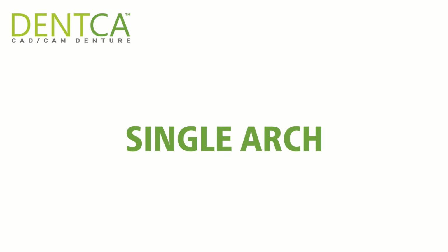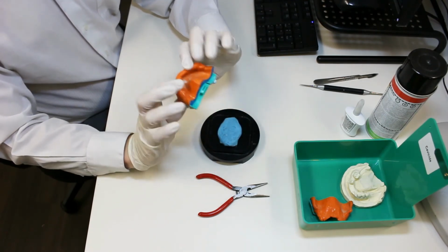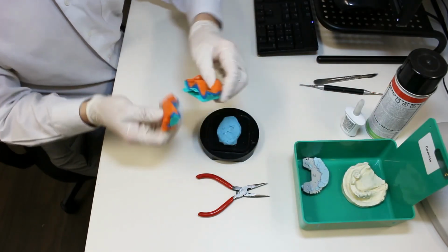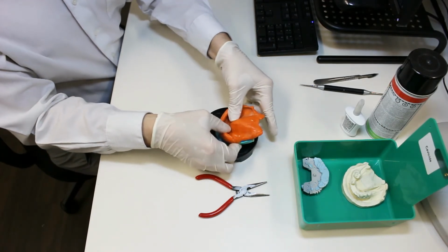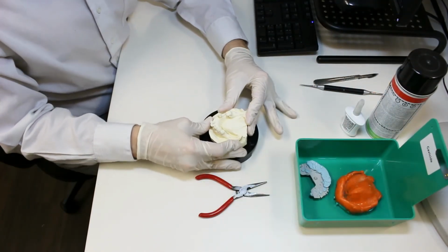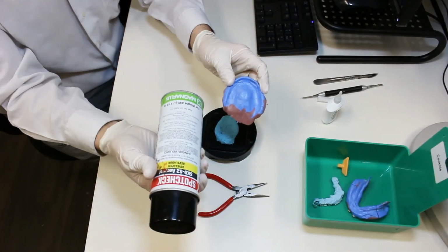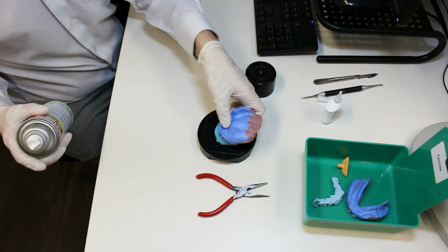For single arch cases, glue the gray plate to the DENTCA tray and place it on the putty facing up. Then in this case we're doing a single upper, so attach the posterior attachment to the upper or lower and glue them together. Position them at a 45-degree angle. As for the stone model, ensure the stone model is facing up with the teeth at 0 degrees. Also, when scanning, certain portions might not scan properly, so it's easy to use a spot check spray to make sure the definition is a little better when scanning.